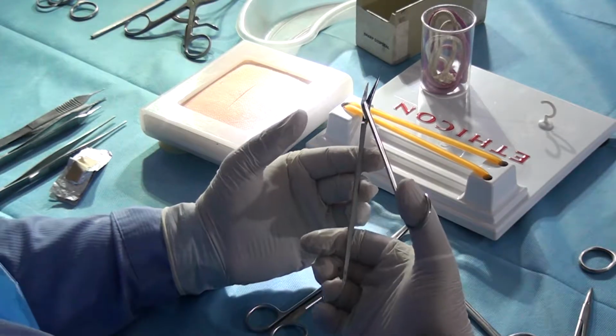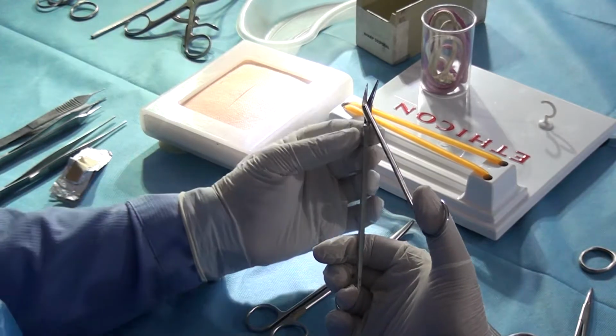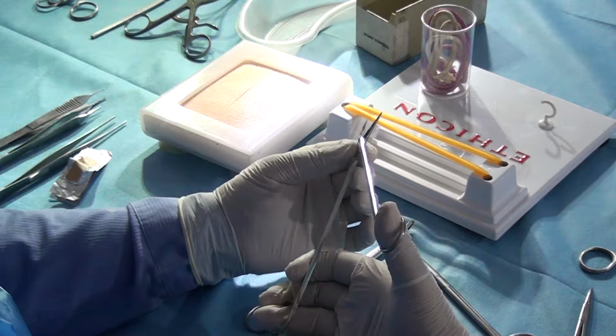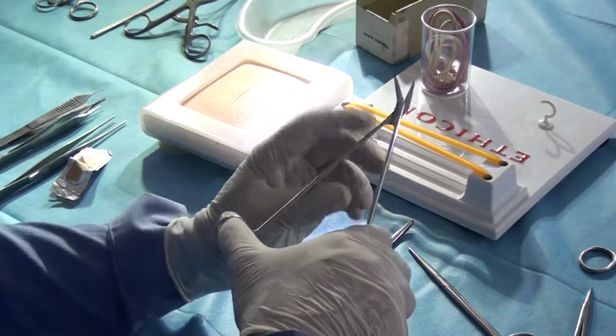Is it visible to all of you? Last row. Loudly. So, thank you. Now, the advantage we have is the handle is long, and can you zoom here, please?